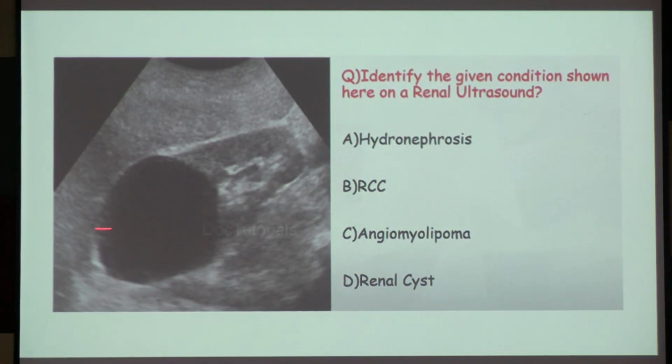So how do you say this is a renal cyst and not a hydronephrosis? Well circumscribed is one thing, very good. Anything else? Okay, what are the things which we are seeing here? First, this is the liver. Doesn't matter whether it is liver or this is the kidney. It's the simple fact. This is a normal boundary of the kidney. This is the normal cortex. We are seeing from the liver, this is a bit black, so it is normal. Absolute black is not required.